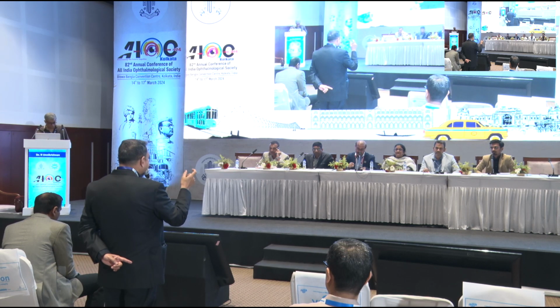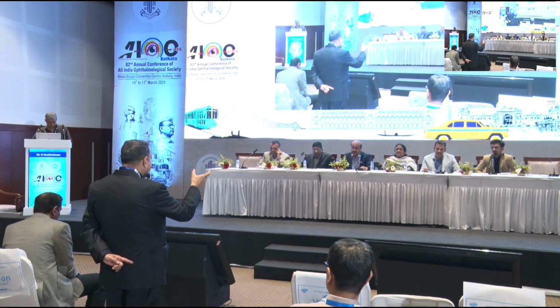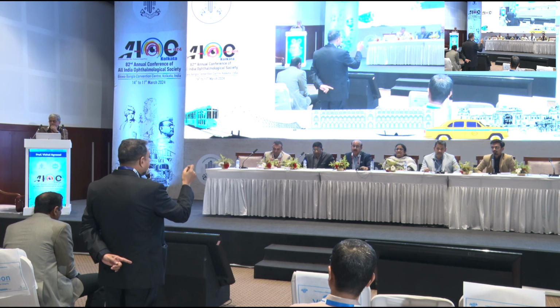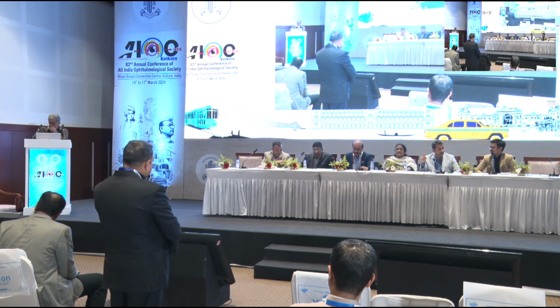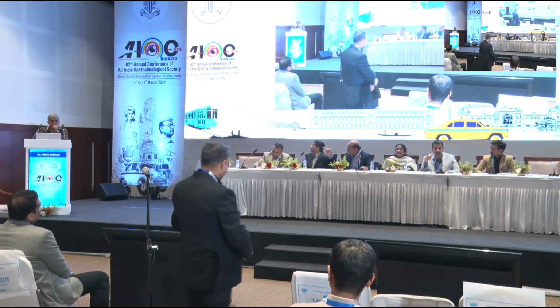That is, at every visit before you do your treat and extend, your OCTA is going to be the tool to see whether the fluid comes. You don't have fluid in TAE, but you're going to see whether the OCT recurrence has started, and that is going to refine your TAE to a great degree. He beautifully told about the signs on OCTA, the fringes, anastomosis, and now even there is an open circuit and closed circuit pattern. The closed circuit pattern is more resistant actually.